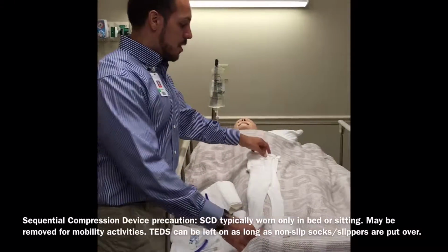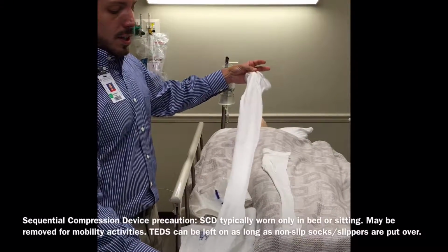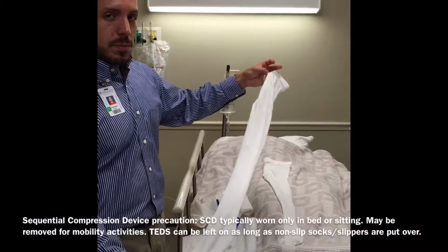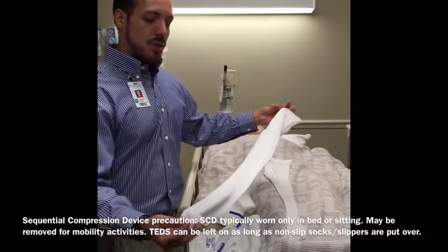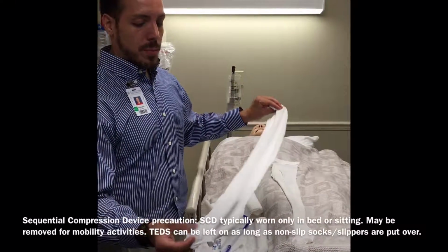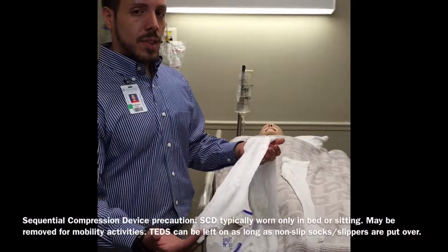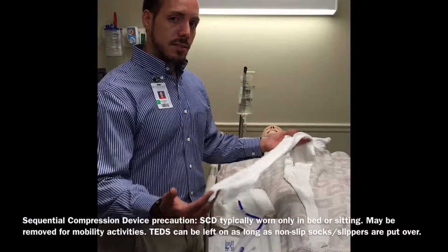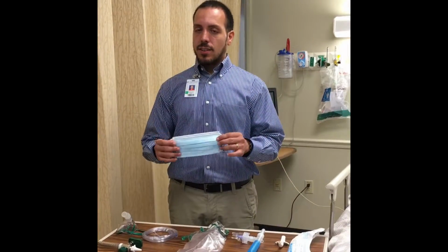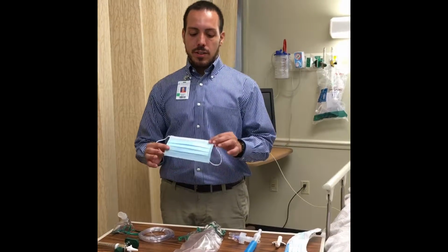What you'll typically see underneath though is our TEDs. So TEDs is just another garment, again, to prevent embolism in the lower extremities or arms, wherever they may be. Just one precaution you might want to remember is you don't want to ambulate the patients when they have these on their legs. You don't have to take them off, but you do want to wear slippers or non-slip socks for the hospital. So the next device is a typical face mask that we use like in class, just to prevent bacteria getting in your mouth.